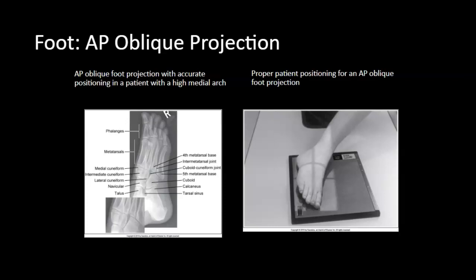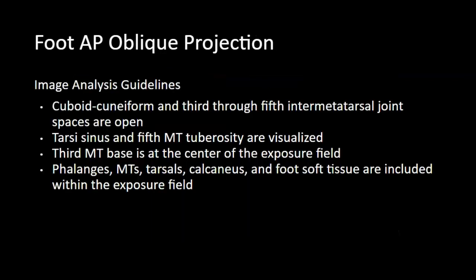The third metatarsal base is at the center of the exposure field, and the phalanges, metatarsals, tarsals, calcaneus, and foot soft tissue are all to be included within the exposure field. Here are those guidelines for you to review.